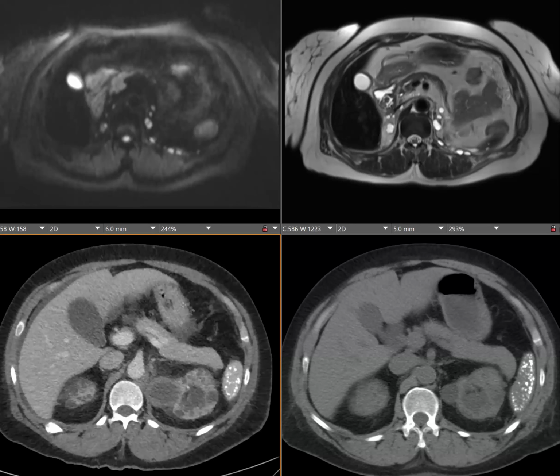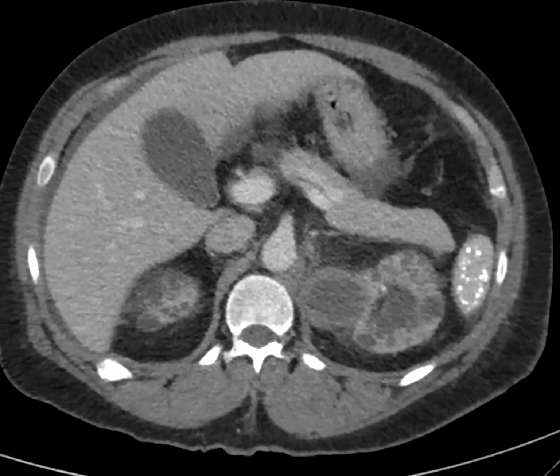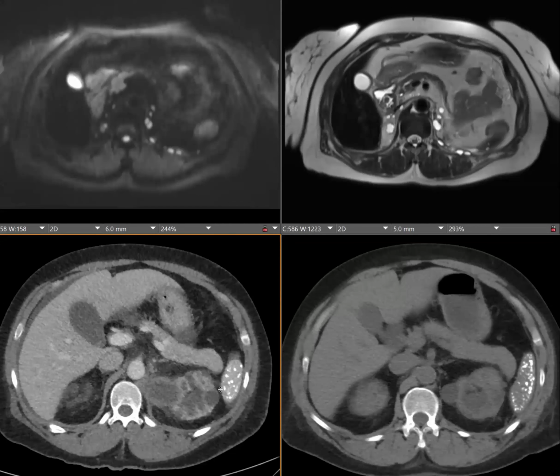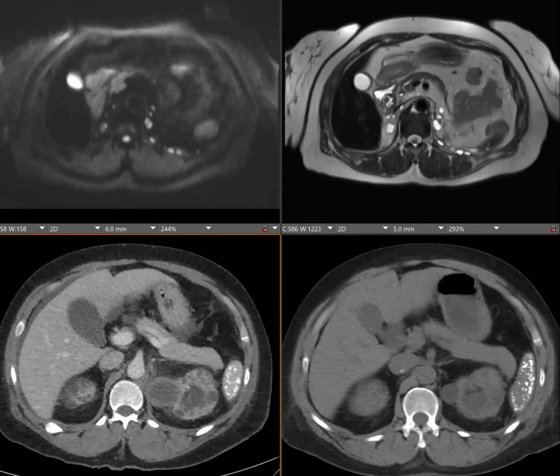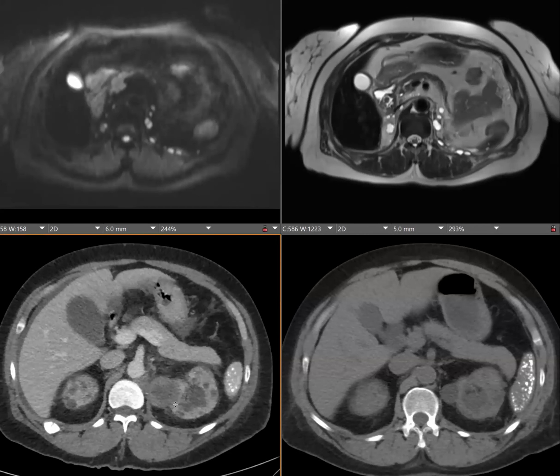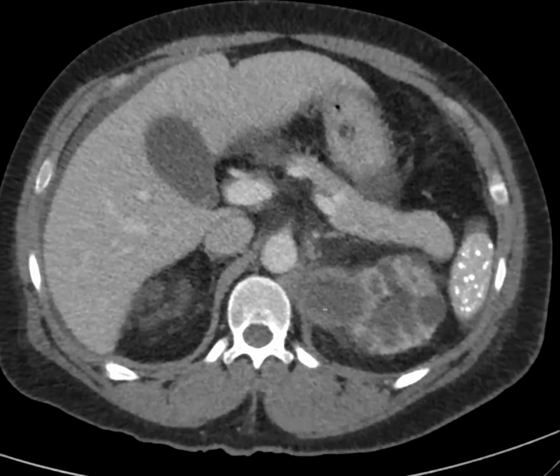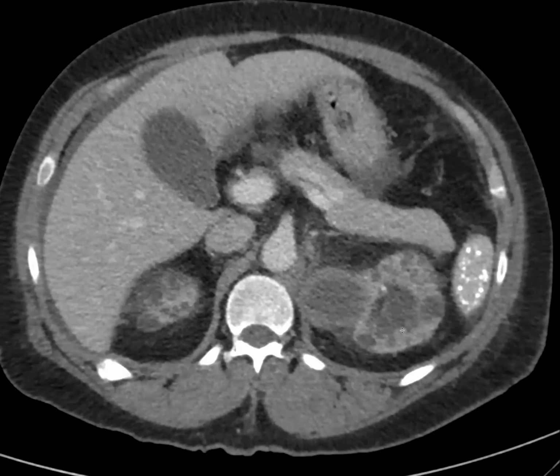Because when we think about cystic, we think about Bosniak, right? Like cystic renal mass. And maybe we don't have MR at that point, so we don't know what percentage of solid. Yeah. Because this was 6 months before, and then 6 months later, this was enlarging in size and developing some thick rind of soft tissue. So they resected this one because they were suspicious about it.